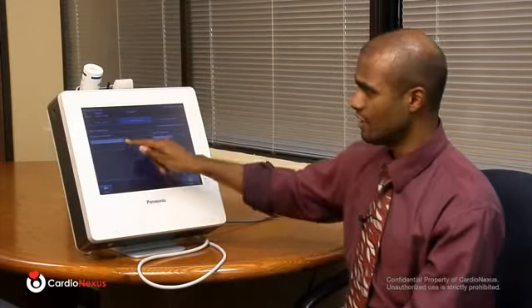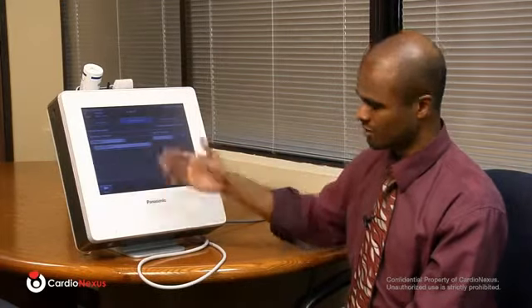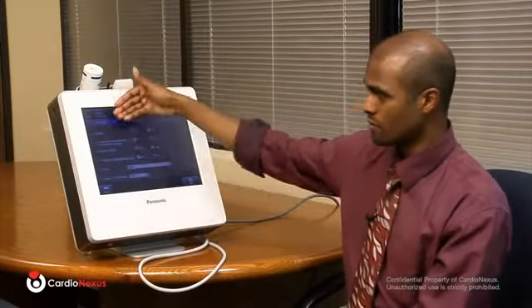We also have the ability to take a full medical history of the patient. So this is per the NIH website. You can just simply choose a disease or condition, specify the disease if it's, in this case, diabetes. You know which kind of diabetes, what type of diabetes it is, age of diagnosis, and then you can simply add or remove as many conditions as you have for that patient. You even have the ability to enter the patient's contact information, mailing address, email address, and so forth. And any information which you enter will be stored within the machine. It can be reviewed at a later time and eventually can be integrated into your EMR system. But the minimum requirements are just on the risk factor page.